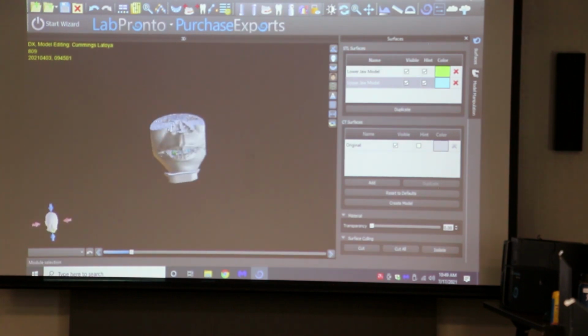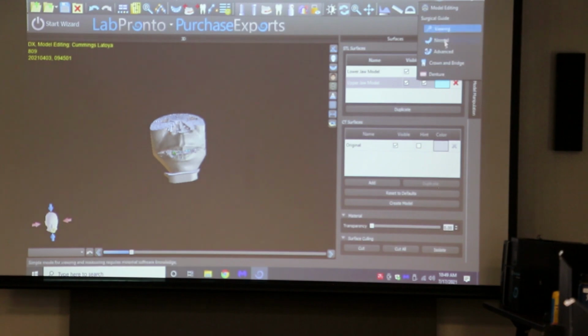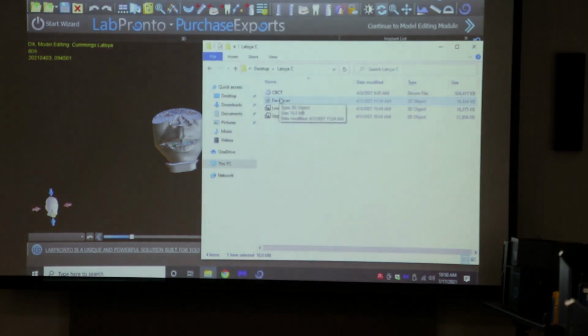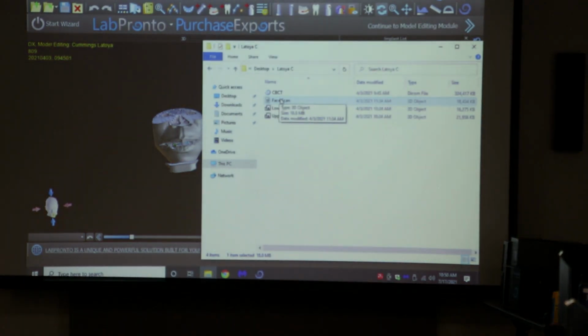Dr. B, do you remember why? Where did you export it from? Did you email it to yourself? Yeah. So there's an OBJ file, and there should be color data that associates with it. That's why. You only exported the object, but usually you should send the whole folder. Do we still have the folder? Maybe we can email it out.